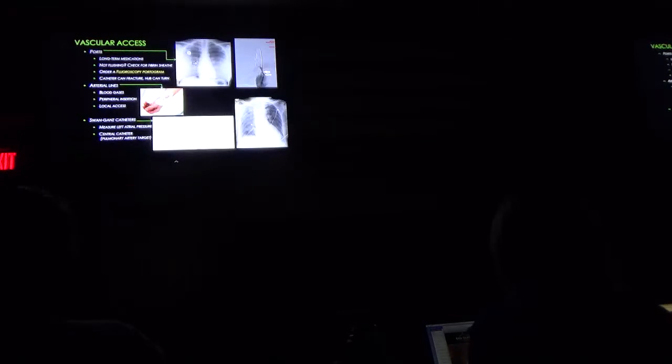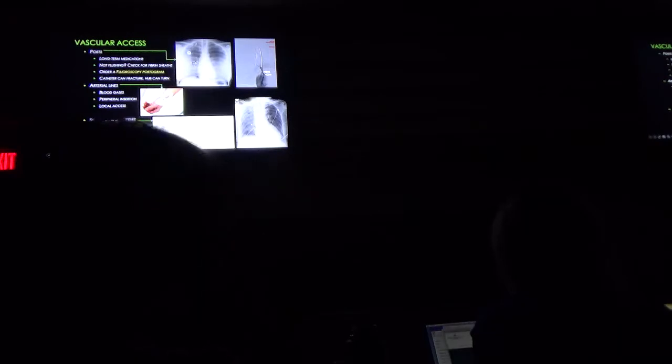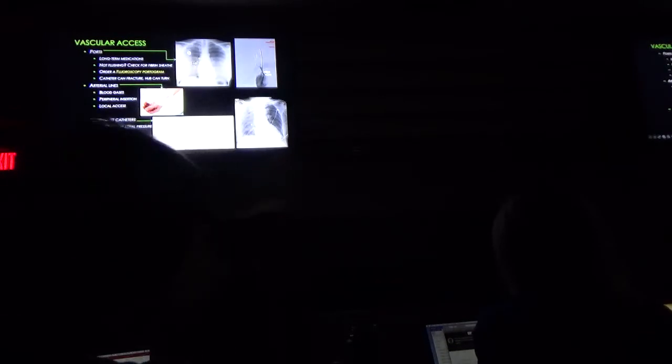If it is not flushing, what you would be doing is checking for what we call a fibrin sheath, because things scar down. Anytime we put anything foreign in the body, it walls it off and tries to scar down. This is a picture of a port here, and the line going in here. So that was one of those tunneled Hickman catheters, central lines, okay, for dialysis.